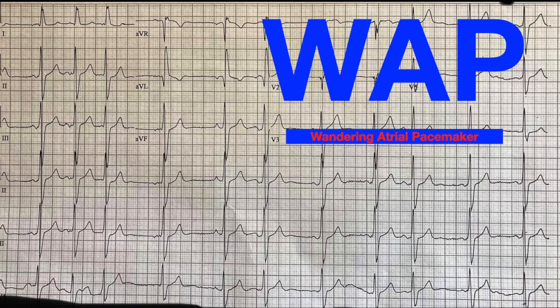The reason's not all that important, but especially in folks with COPD of advanced age, you'll see this happen sometimes, where other bits of atrial tissue start creating P waves, and those P waves propagate just like they always would and go down to the AV node. So it's still a rhythm that comes from above the AV node, but it doesn't necessarily come from the sinus node every time. And that's what you see here. When you see different P waves, different morphologies, you have, in this case, a wandering atrial pacemaker.